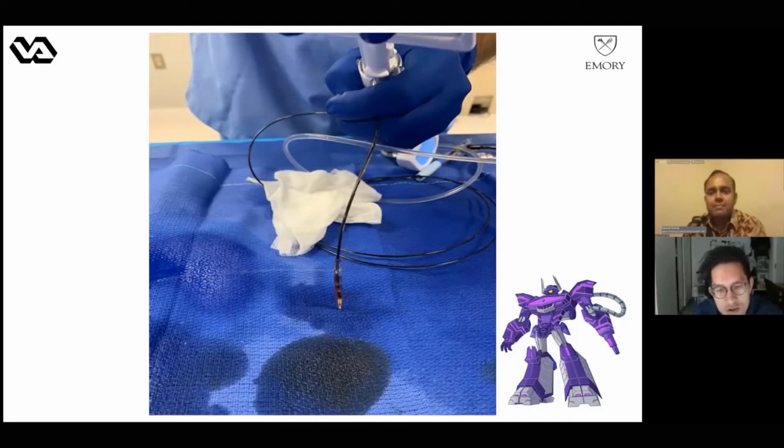So the initial 4 to 5 runs are okay, but at 6 to 8 runs, after repeated inflation, it is more prone to rupture. Some of my colleagues go up to just 2 atmospheres for the initial 4 runs, and go up higher to 4 in the second half of the inflation.